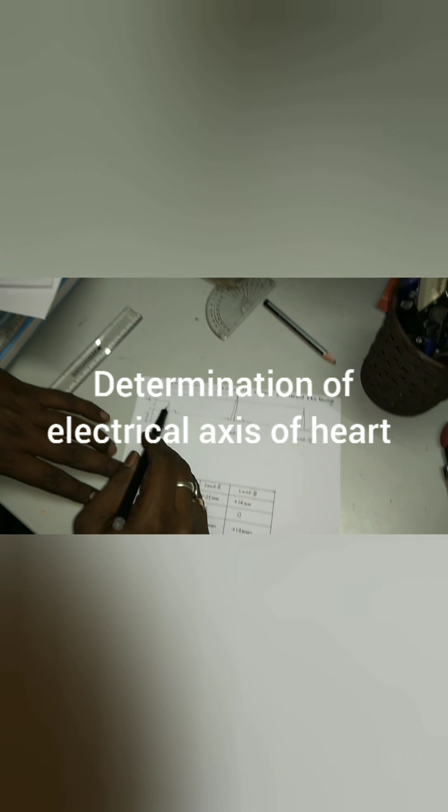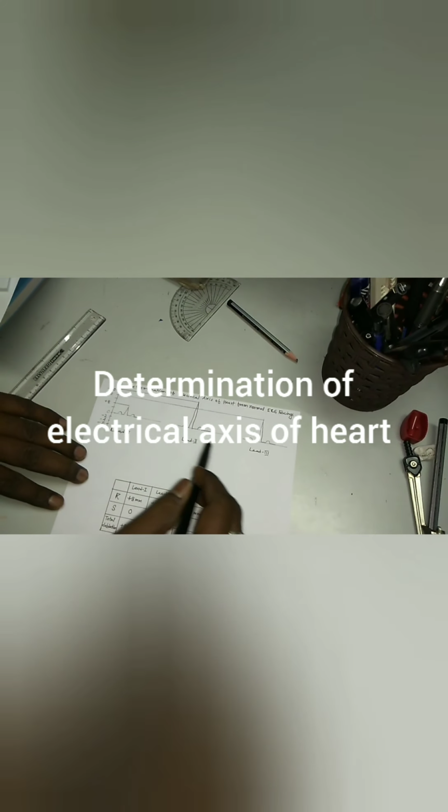This is the curve for lead 1, this is for lead 2, and this is for lead 3. Now these are the respective positive and negative signs. If the peak is upward, then it is regarded as positive, and if it is downward, then it is regarded as negative.